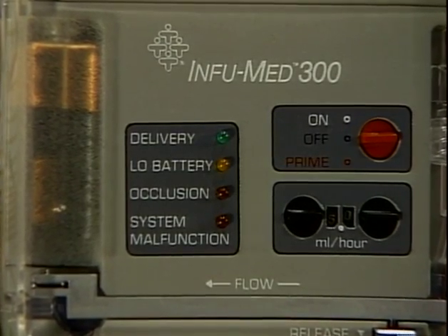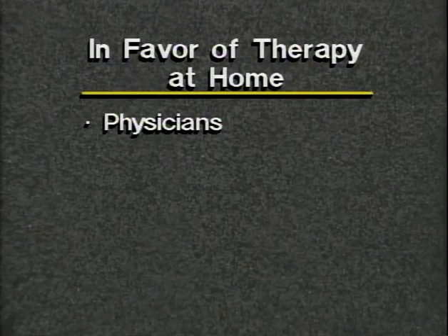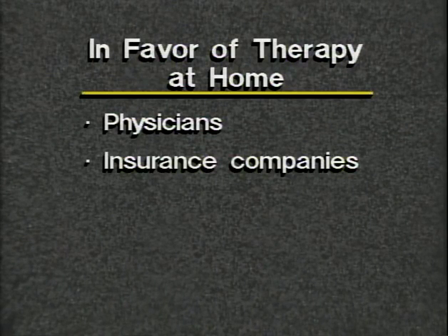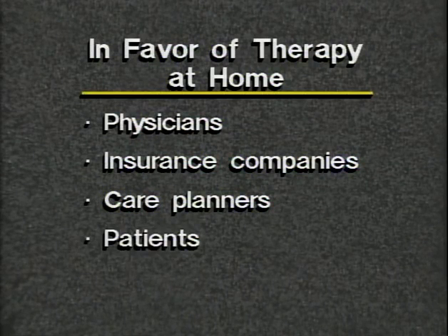A pump is a safe, reliable way to administer medications and fluids in the home. Physicians are more confident about treating their patients at home because of a proven track record for safety and patient compliance. Insurance companies and care planners recognize the potential for cost savings and patient satisfaction. And patients wholeheartedly approve. There is no place like home, especially when illness strikes.